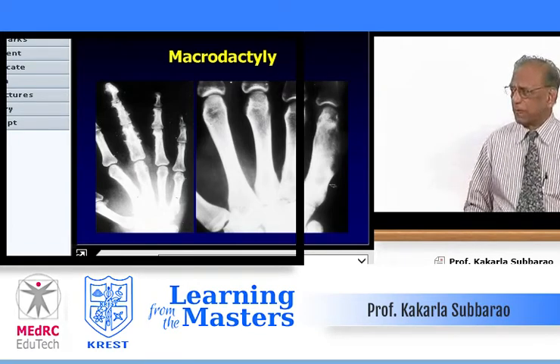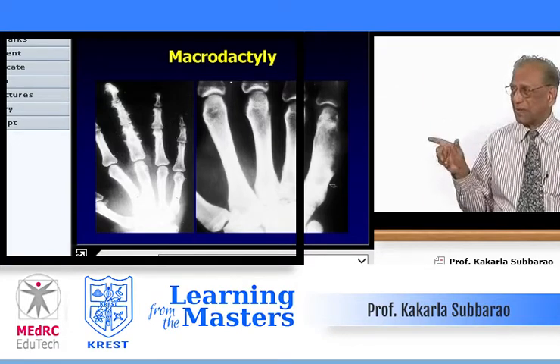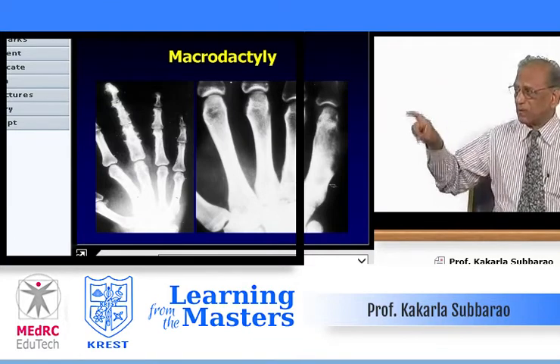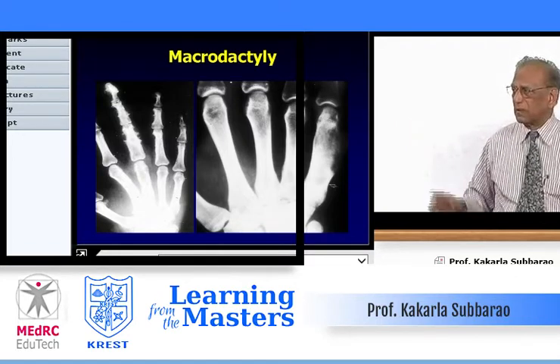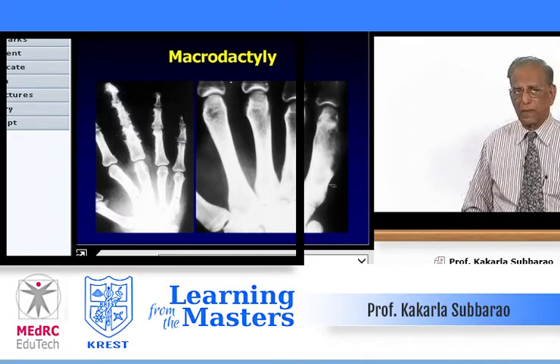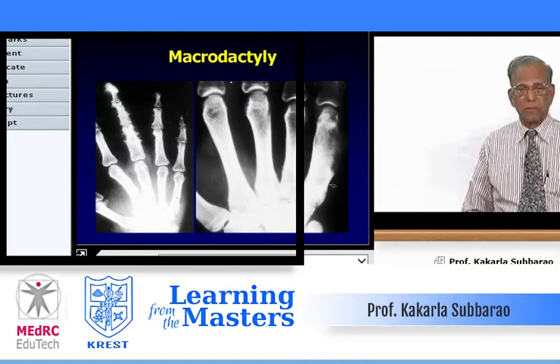And the one on your right side is again a hand, the epiphyses are just closed, about 17 years old. But if you look at the fifth metacarpal, it is expanding not locally, not horizontally, but vertically, all the way to the metaphysis. And there is a little scalloping also on the medial side. And if you look at the matrix, it looks like ground glass. Immediately in a child, a ground glass appearance, expanding lytic lesion, you should think of fibrous dysplasia.